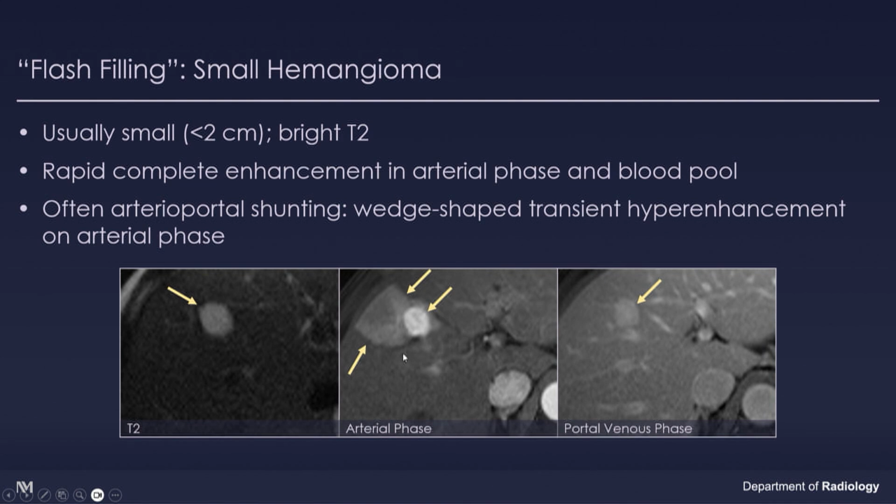But what's interesting here, and you see this on CT as well, is you get these transient signal intensity differences on MR, also referred to as THAD or transient hepatic attenuation difference on CT, and we see them quite frequently with hemangiomas. So this part actually often will make me look for the central area to see if there's a mass, and sure enough, you see the mass. In this case, as often the case, it's due to hemangioma.